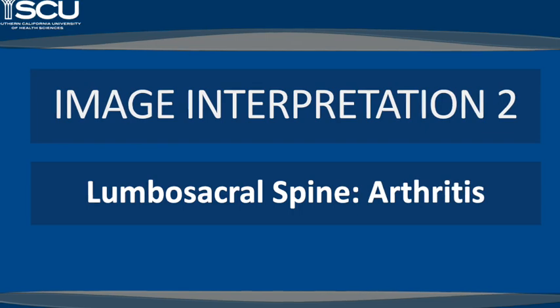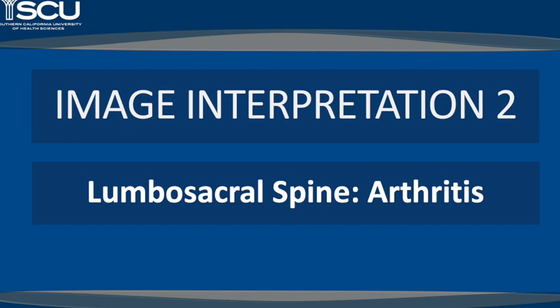Continuing with the radiographic features of ankylosing spondylitis in the spine, we may observe erosion of the vertebral body corners, known as the Romanus lesion. Squaring of the vertebral bodies anteriorly. The shiny corner sign, where the eroded corners heal, appearing dense and shiny. Ossification of the outer annular fibers, forming syndesmophytes. Marginal syndesmophytes originate at the vertebral margins and are the most common type.